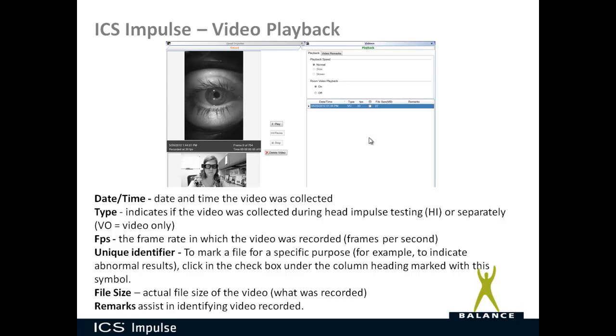So there's a lot of factors that determine the file size. If you're using 120 frames per second uncompressed, with a color webcam at 30 frames per second, that's the largest file you're going to have. They are going to get quite large, especially if you record for multiple minutes, half hour, whatever. So you really want to look at that file size.